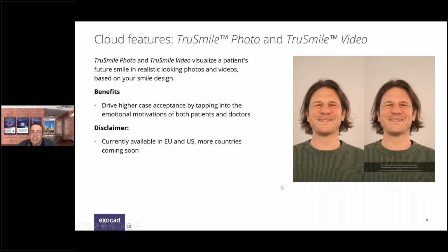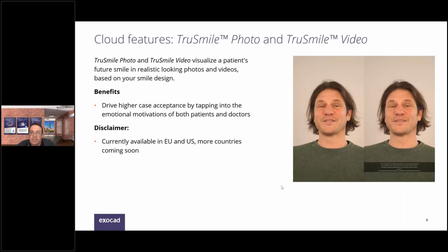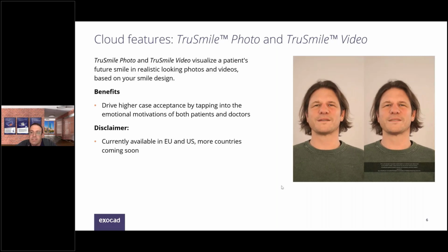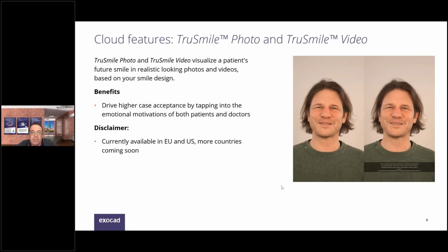Here's a little video clip, just in case you haven't seen this tool yet. This is a video clip, the original video on the left, and our mock-up design of the patient on the right side. The patient is speaking, and the design that we've done in Smile Creator is embedded in the video clip for patient presentation.